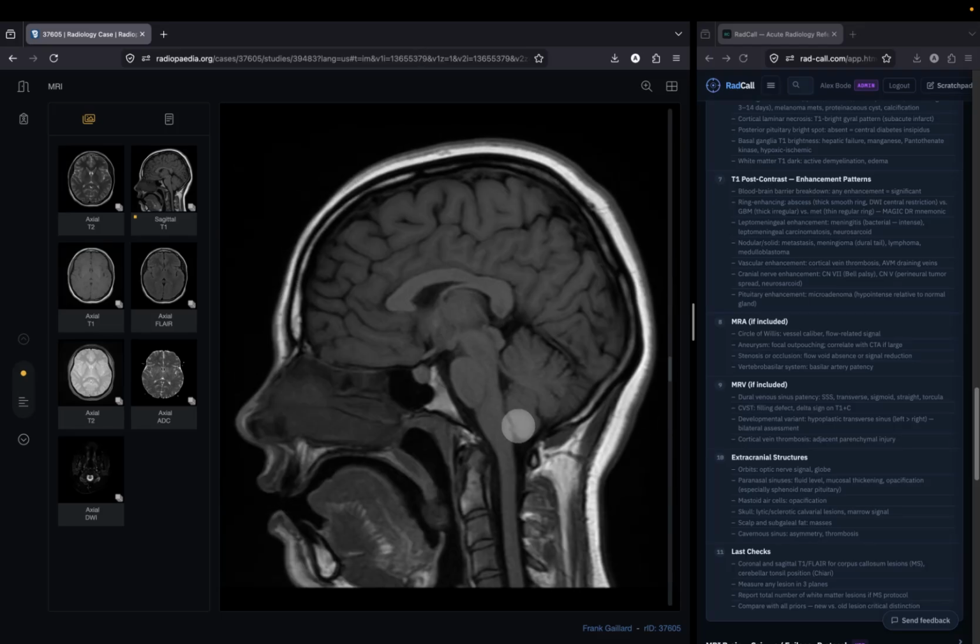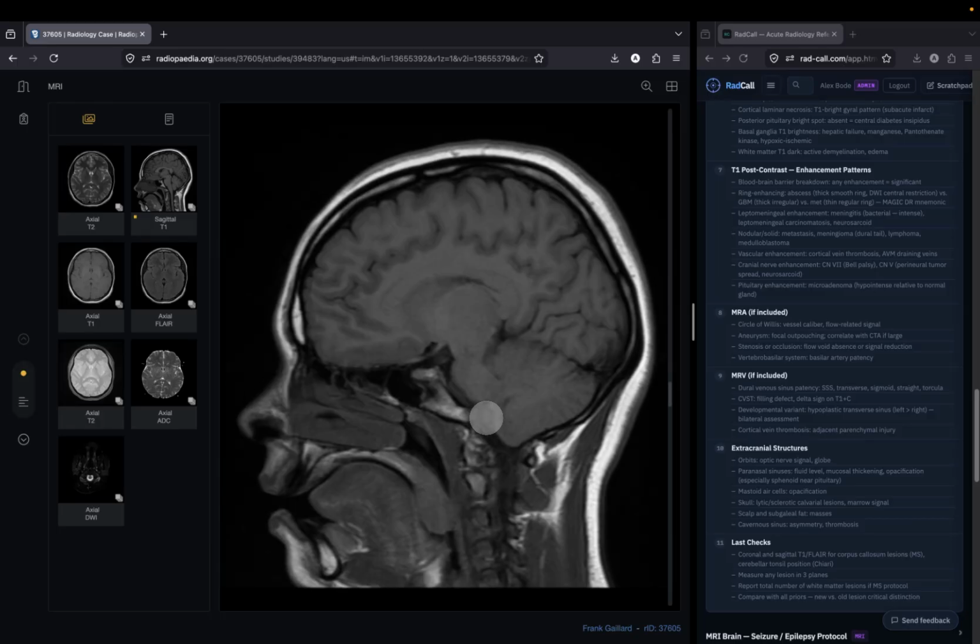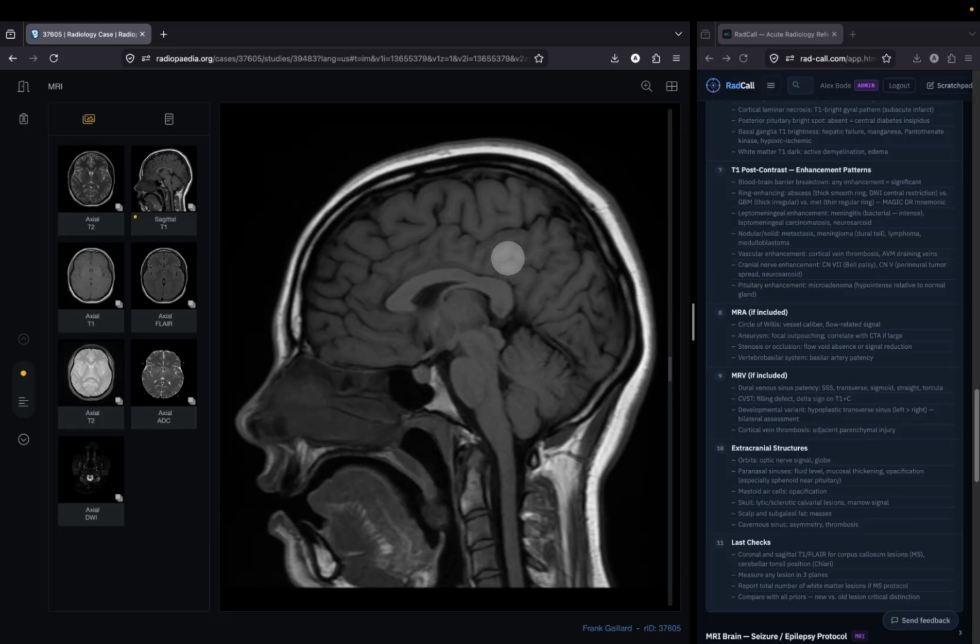Make sure that there's no cerebellar tonsillar herniation or posterior fossa malformation. Looking at your pituitary gland, making sure it's not enlarged or abnormally expanded, or empty in patients with IIH. And then in this case, it's a completely normal study, so we don't have much to talk about.